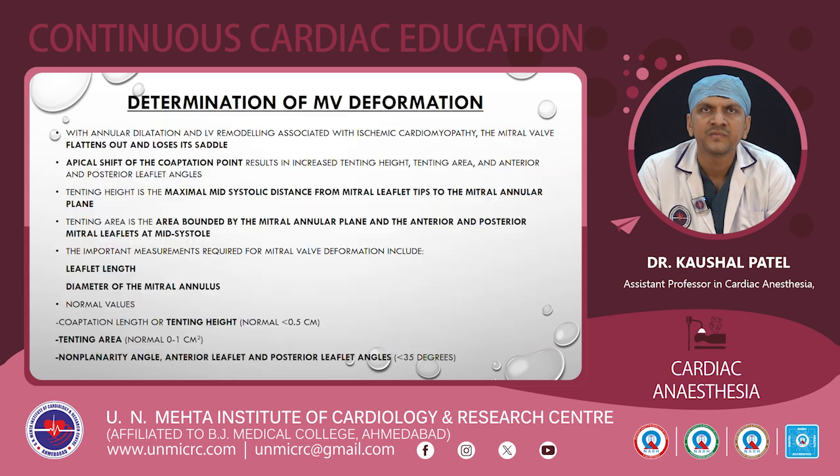Now, coming to the determination of the mitral valve deformation. With annular dilatation and the LV remodeling associated with ischemic cardiomyopathy, the mitral valve flattens out and loses its saddle shape. So there is an apical shift of the coaptation point, resulting in increased tenting height, tenting area, and the anterior and posterior leaflet angles. The tenting height is the maximal mid-systolic distance from the mitral leaflet tips to the mitral annular plane. Tenting area is the area bounded by the mitral annular plane and the anterior and posterior mitral leaflets at mid-systole. The important measurements required for the mitral valve deformation include the leaflet length and the diameter of the mitral annulus.